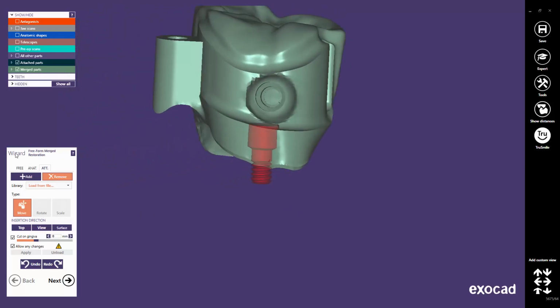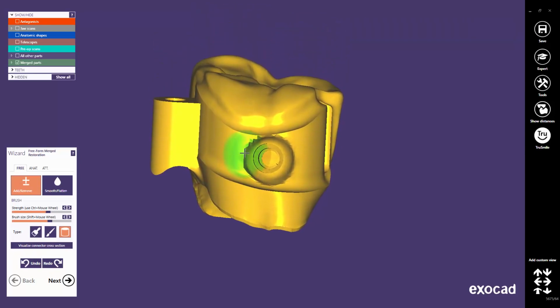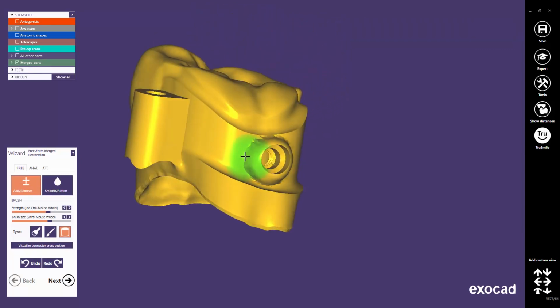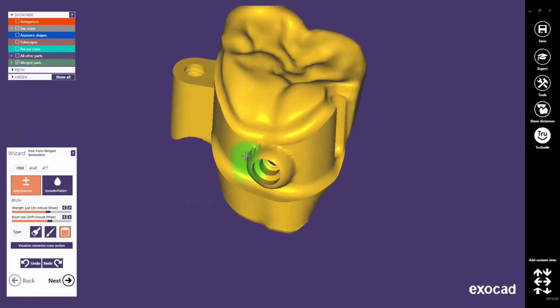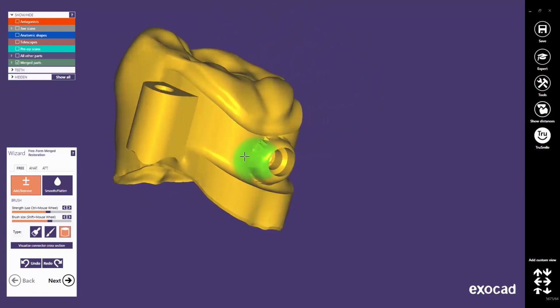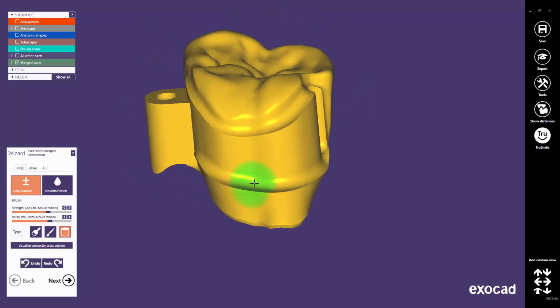The Allow Any Changes feature offers unexpected possibilities, as you can create, for instance, together with the Align to Implant Insertion option, another screw channel in a coping on the abutment. Let's undo these operations, as they have just been an example for this feature.